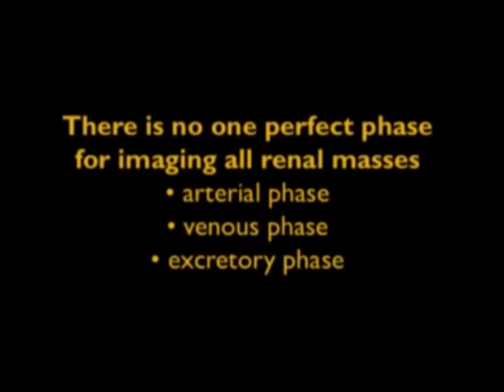This also makes the point about phases with the kidney, that there's no perfect phase. Each phase has certain advantages, but in my mind, for classifying and detecting lesions, if you gave me the non-contrast, obviously, but arterial and excretory, I'm going to be perfect. Venous can help you sometimes with vascular invasion, but otherwise, I don't think it adds a lot.